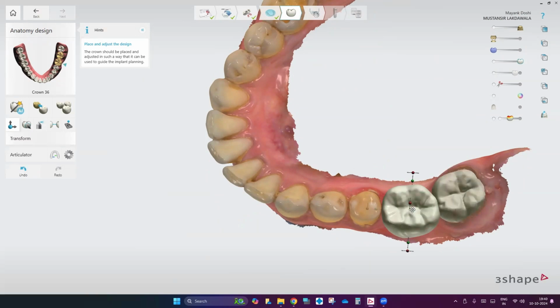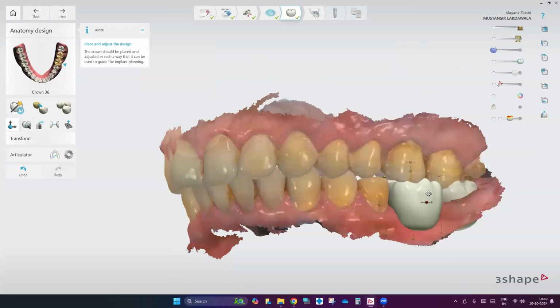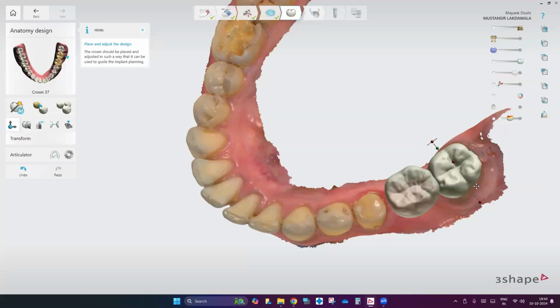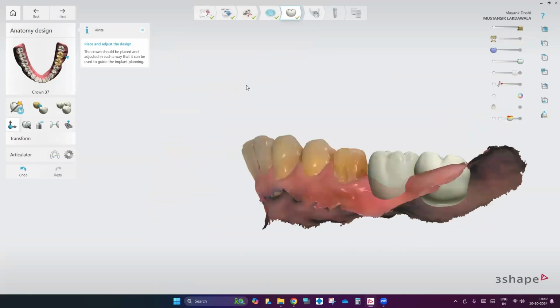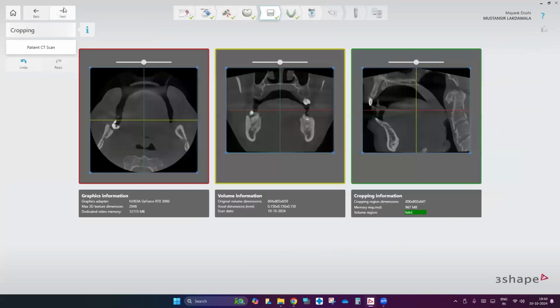Yeah, much better. Much better now. Let's check. Okay, they can go a bit in still. Rotate a little. Squeeze a little. Squeeze a little. And a little more inside. Same with this. All right. Looks good. No need to achieve perfection over here. And click next. I don't want to sit and crop anything.